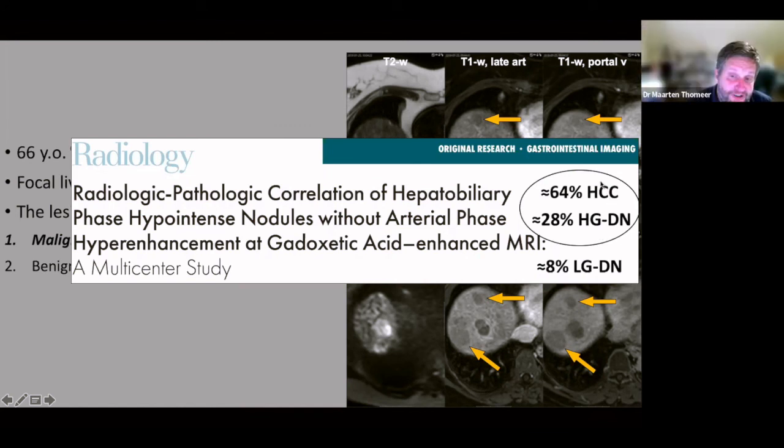So according to LI-RADS, you would call it a LI-RADS 4? Yes. And a LI-RADS 4 has what percentage chance of being an HCC? It's about 70. So 70, it's still worth it, no? 70, yeah. But you can't take a decision that this is an HCC. No, of course, but with this publication neither.